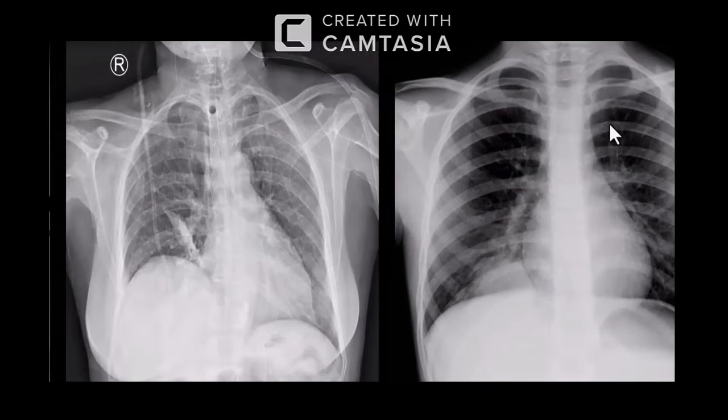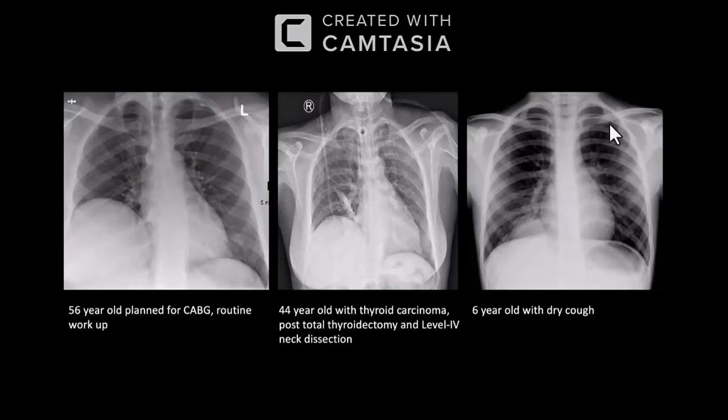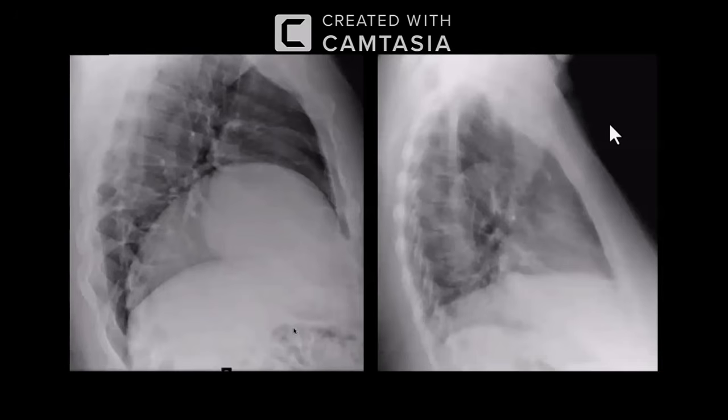Okay. So actually, I have got a lateral radiograph of the first two cases. Just have a look, maybe kind of helpful for your diagnosis. So the first case, the lateral radiograph, there's a very smooth contour. There is no focal area of bulge. So it doesn't look like Bochdalek or Morgagni hernia. It looks more like a complete diaphragm elevation, which can be a normal variant.